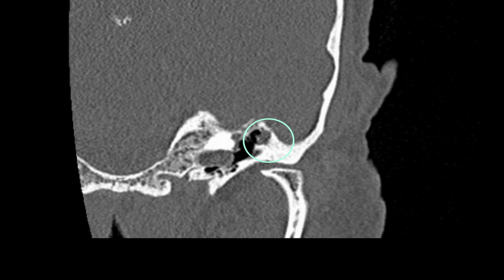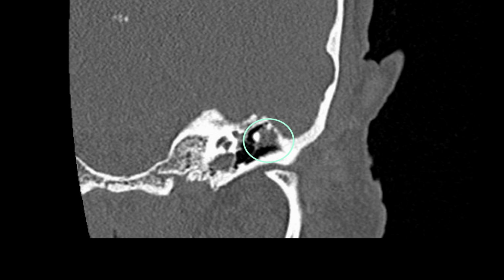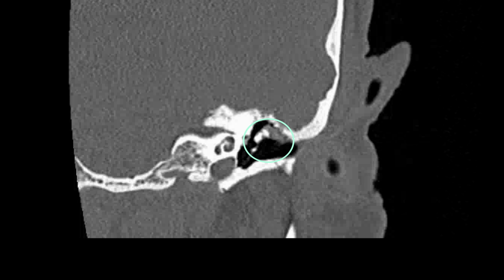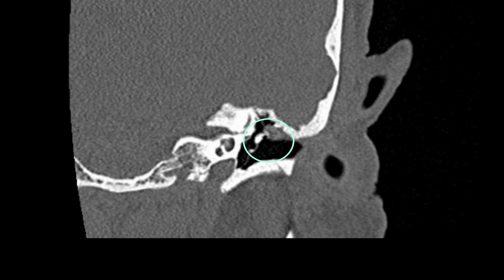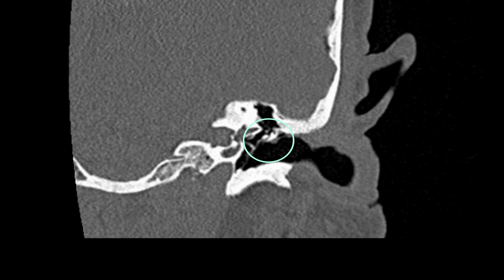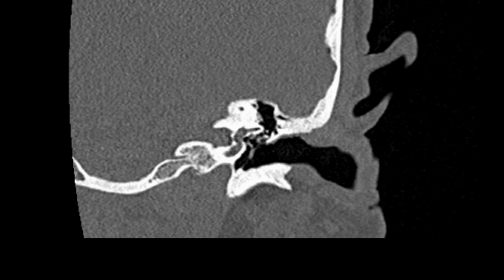If we now look at this region on a temporal bone CT, you can see there's abnormal opacification within the left middle ear eroding the adjacent bone, and this is from a cholesteatoma, which is a non-neoplastic growth of keratinizing squamous cells that produce inflammatory keratin debris that, you guessed it, causes restricted diffusion in a place where there should be none.